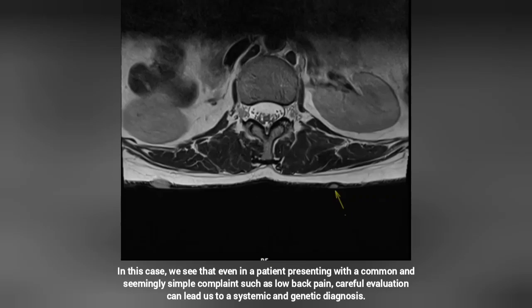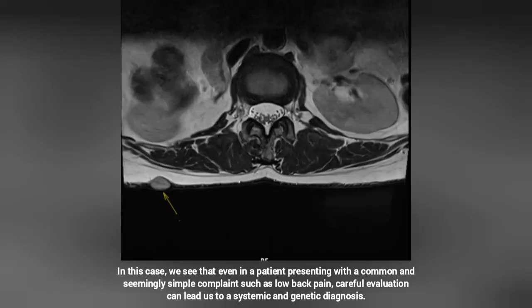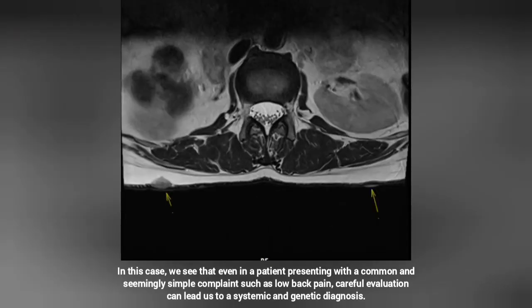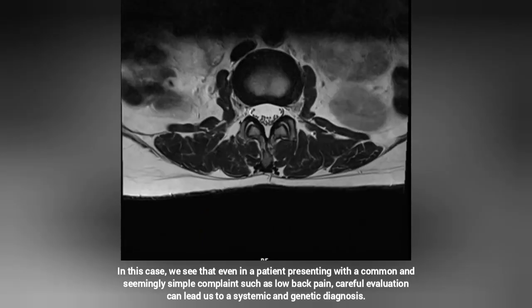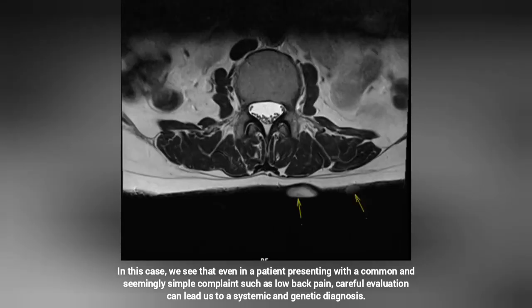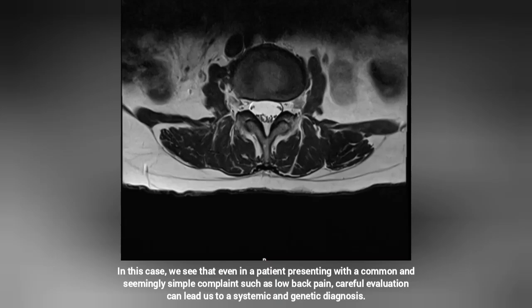Now I proceed to the axial T2 images. On these sections, the multiple nodular lesions in the subcutaneous tissue are much more clearly visualized. These multiple exophytic cutaneous lesions are suggestive of cutaneous neurofibromas.